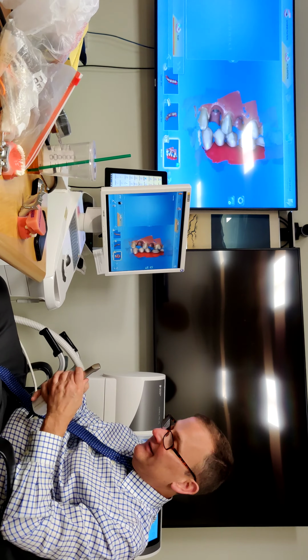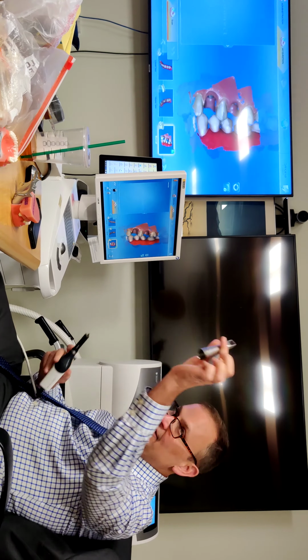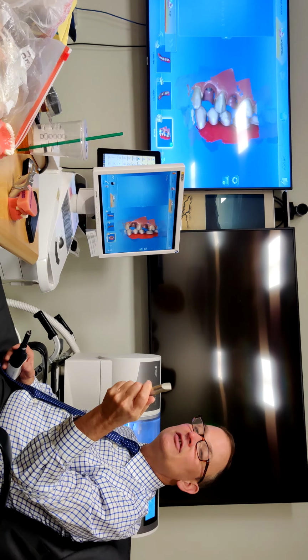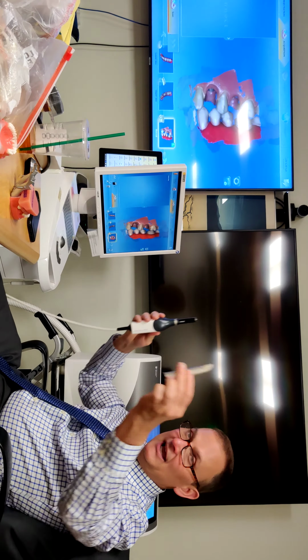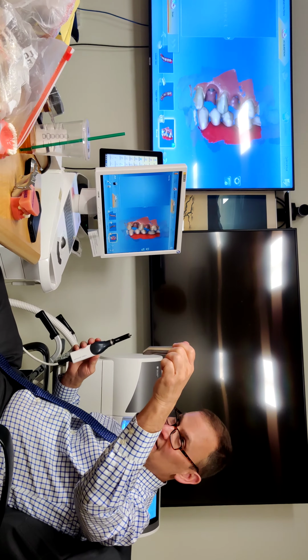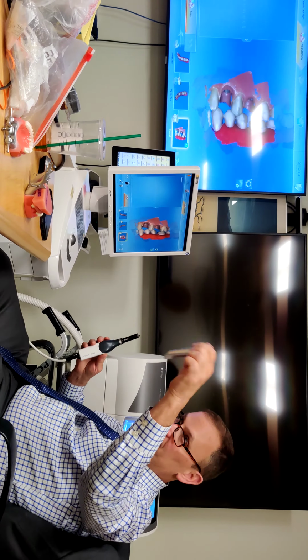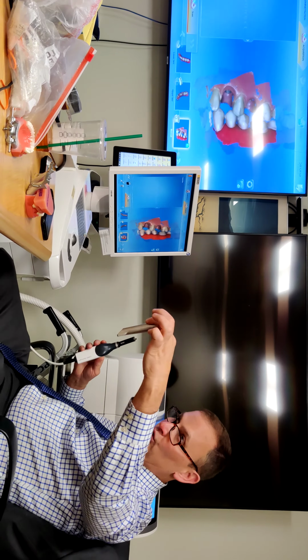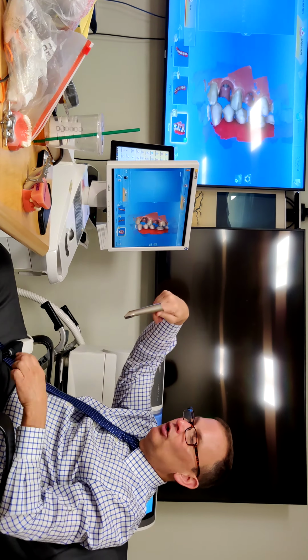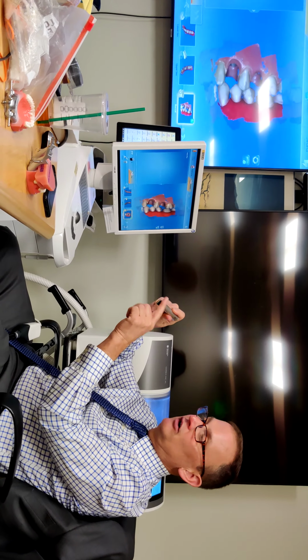I don't know how y'all are doing it here, we can talk about that. But this sleeve is $750 or something. One way of doing this is to cover this with plastic wrap and buy these sleeves for $750, and the VA doesn't allow heat disinfection or heat sterilization. So these have to get high level disinfection through SPS. They soak it, but they're supposed to use a stopper. If the soak stuff gets inside, it ruins the camera, the lens, and the mirror.